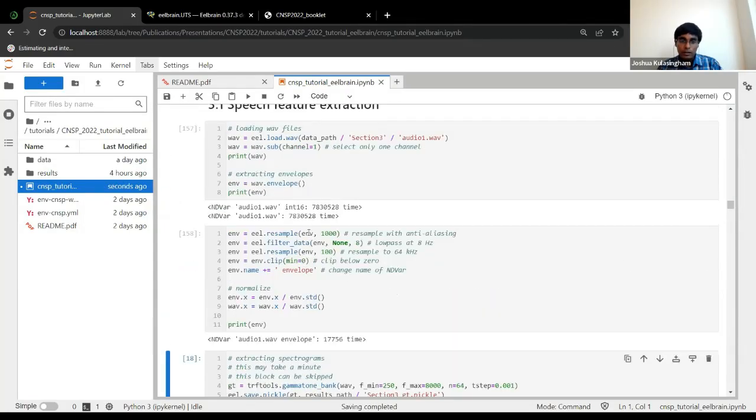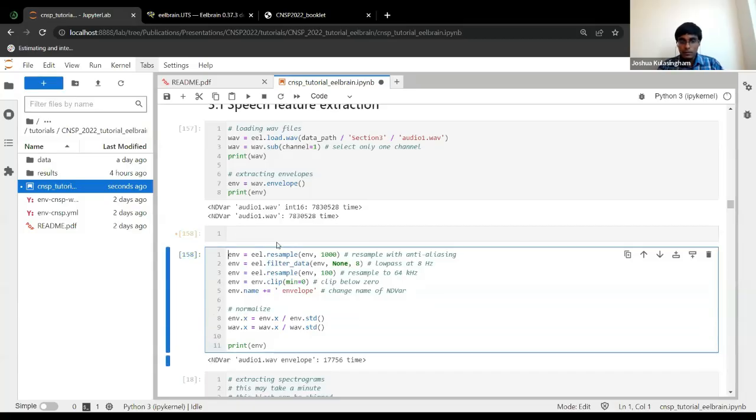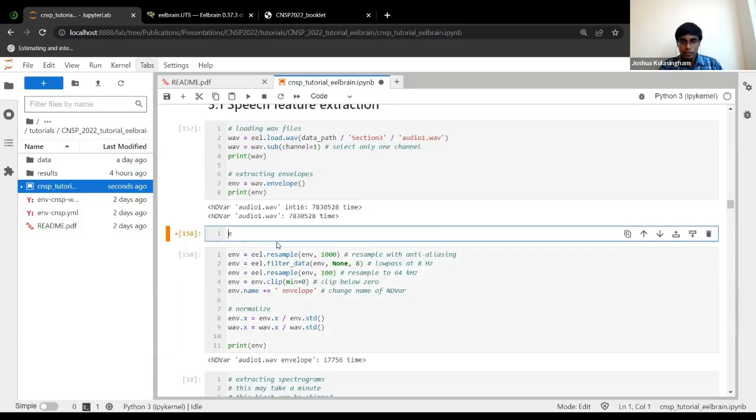So, oops. You can do like eelbrain.plot.